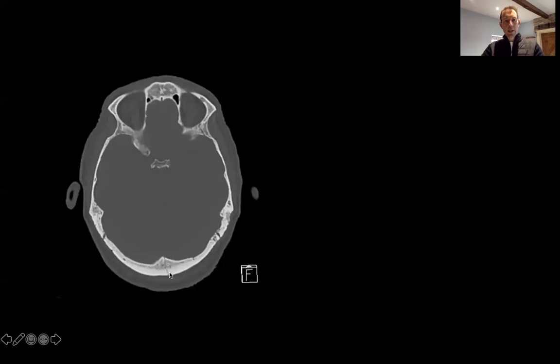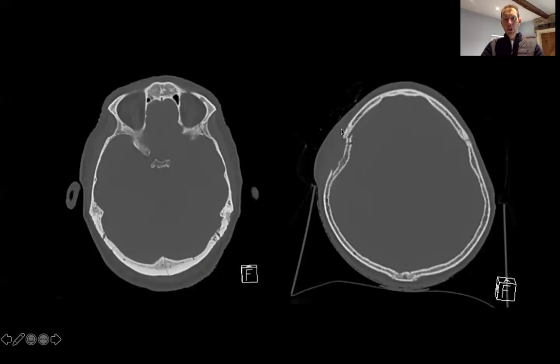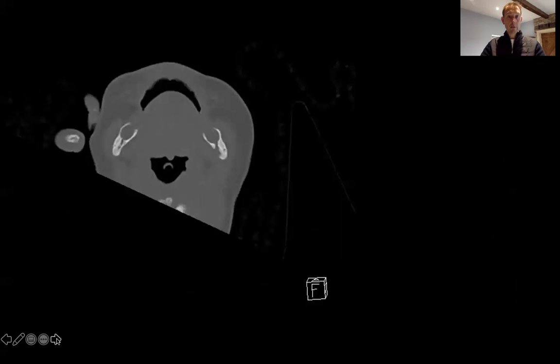So here is a very common pattern of injury we see with an occipital linear fracture where somebody's hit the back of the head, commonly either falling downstairs or perhaps in a fight on a Saturday night and injuring the back of the head. Here we've got a depressed fracture. So this was from a direct attack from an axe, which is a depressed fracture. So it tells you a lot about the forensic nature of that head injury, and also tells you about the pattern of brain injury that you might see underlying it.